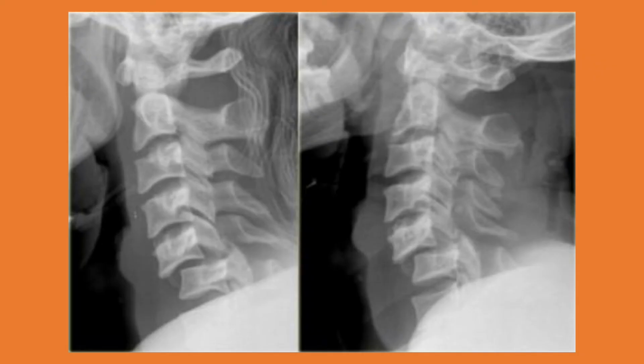And here, it is pretty much obvious that your alignment is off. And this is actually an example of a bilateral facetal dislocation, how it looks. You can see that between 5 and 6, there is an anterior listhesis, which is more than 50%, which actually tells you there is a facetal disruption, and it's most possibly a bilateral facetal dislocation.